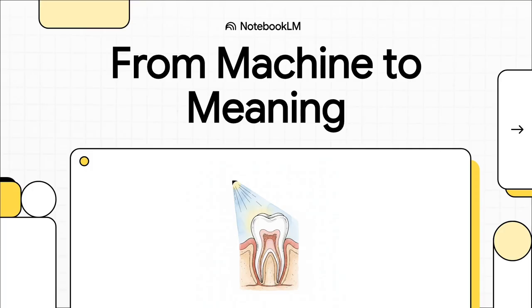Have you ever wondered how a super quick flash of light can tell this whole detailed story about what's going on deep inside your teeth? Well, today, that's exactly what we're going to do. We're going to demystify the dental X-ray and go on this journey from a really complex machine to the crucial meaning it has for your health.